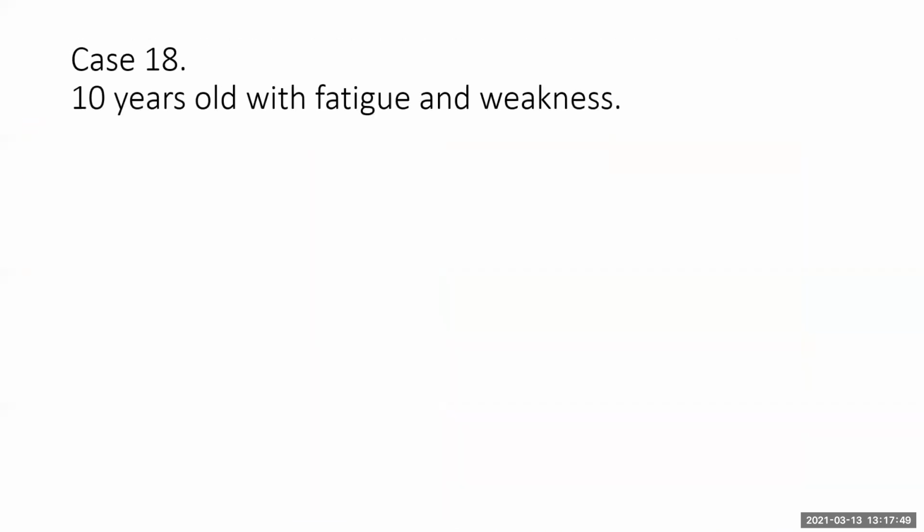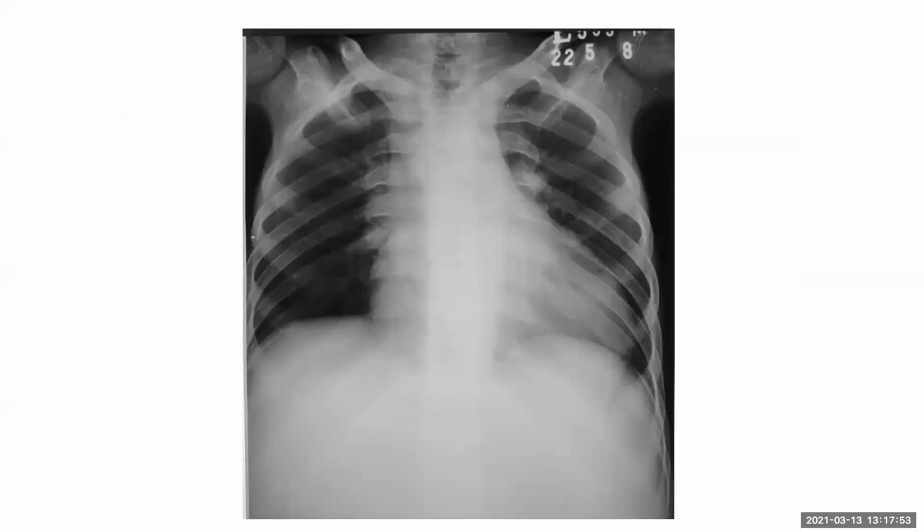This is another case. The next is a 10-year-old child with fatigue and weakness. I have been given a radiograph of the chest and upper abdomen. I'm looking carefully and systematically. I can see the right lung is relatively lucent in a patient with fatigue.